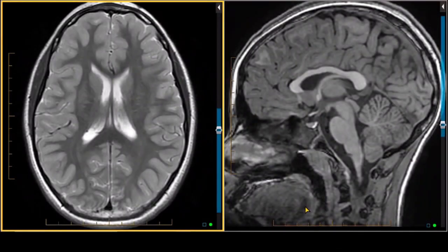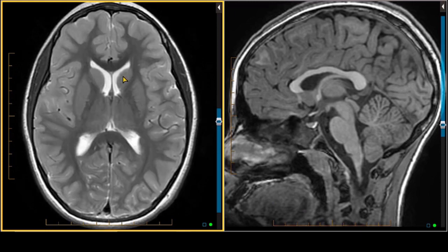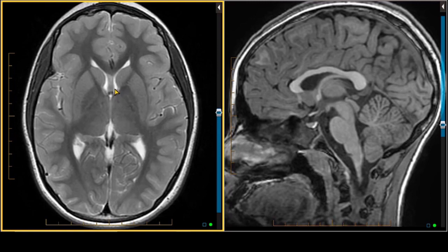This is an MRI of the brain in a 9.5-year-old child with headaches. At first glance, everything looks normal. In a normal MRI, I look for the size and symmetry of the lateral ventricles. The lateral ventricles look normal size and appropriate morphology and symmetry.